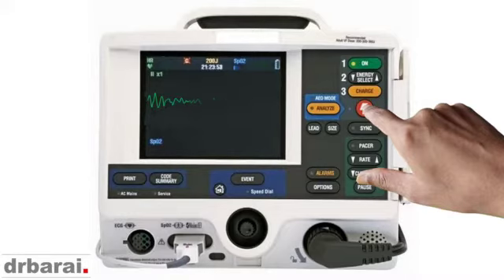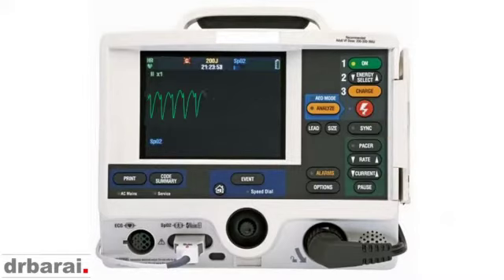So as you can see, this demonstration of VF cardiac arrest in front of you on the defibrillator machine can be very useful. Let me show you another patient. This is a 60-year-old gentleman who collapsed in the emergency department. Fortunately, the defibrillator machine was connected and we can find the rhythm here. This is wide complex tachycardia.